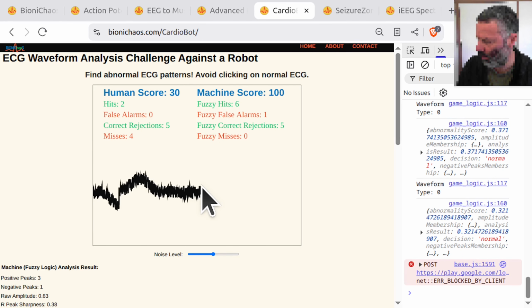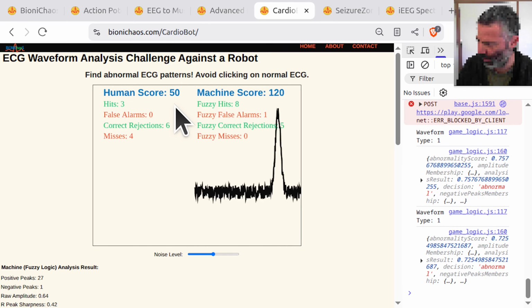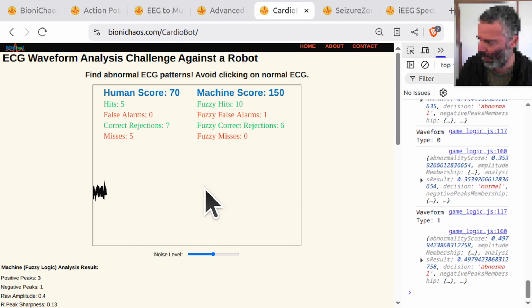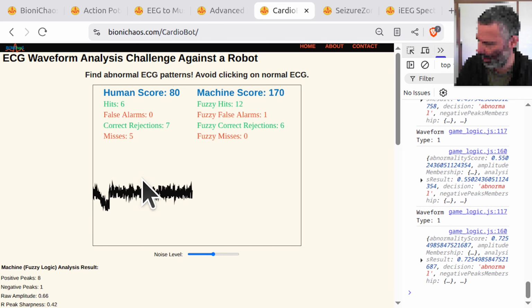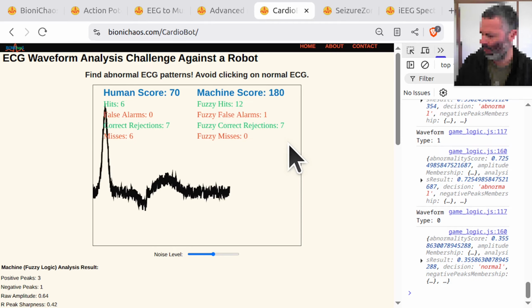That's normal. It's abnormal, and now it's going faster. It's working okay. Did I actually make a mistake? That's definitely abnormal. Same one. Yeah, this. Okay, that's wrong.